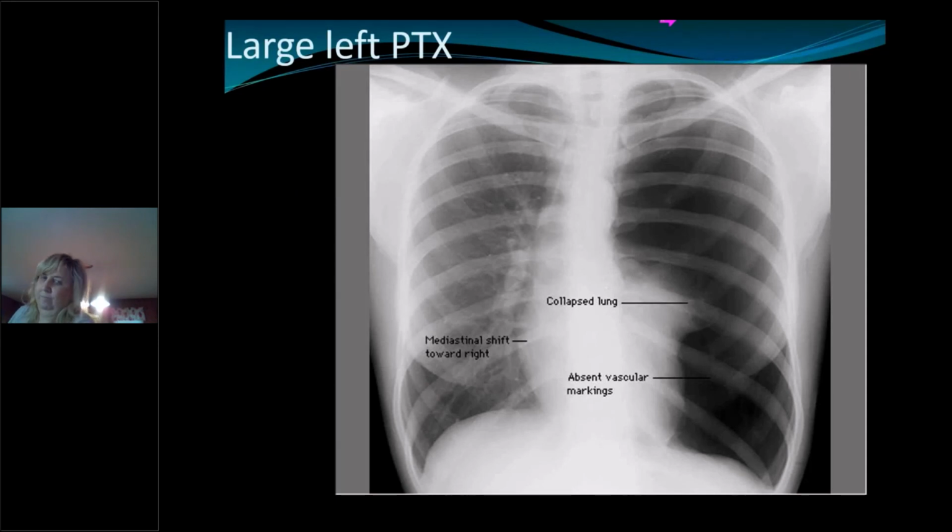And again, now we're looking at a patient who came in acute short of breath. If we look at the picture on the lungs on the side here, we do see nice pulmonary vasculature. That looks normal. If we look over here, do you see any pulmonary vascular markings at all? The answer is no. What's left of the lung is right here, that's outlined.